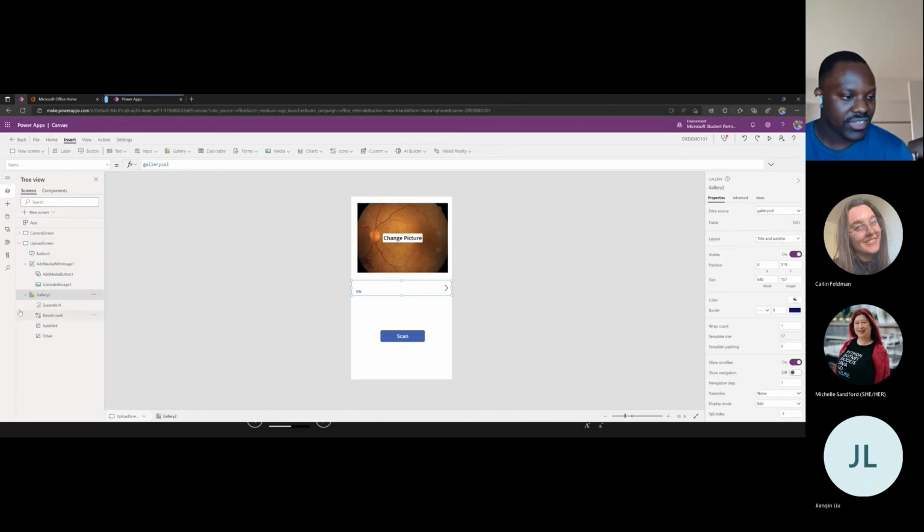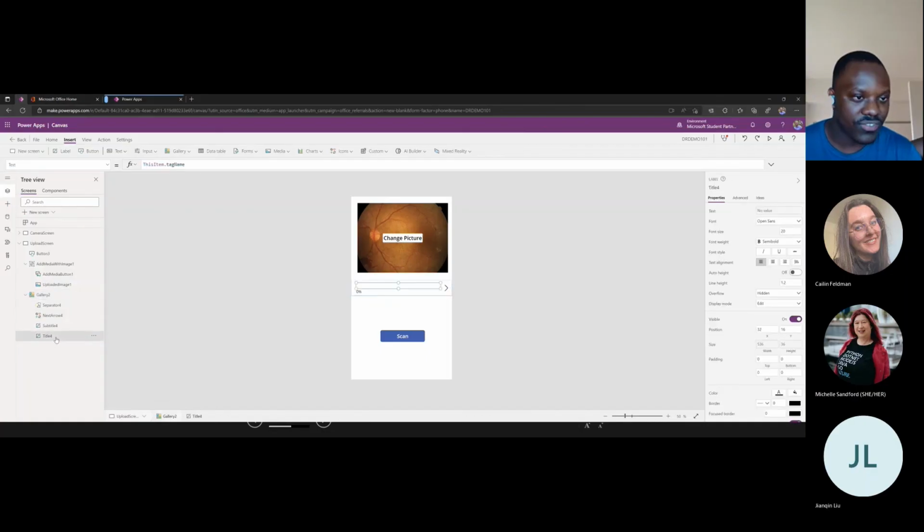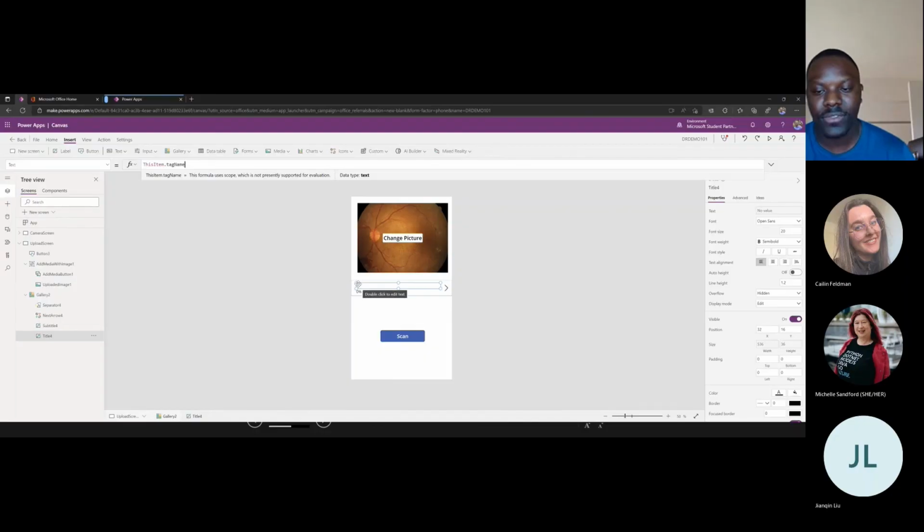With that, what we did was change the title. The title earlier was tag ID, and I changed it from tag ID to tag name, because we wanted to say what the name is. So is it DR positive? Is it DR negative? That is why tag name is useful in this case rather than tag ID.